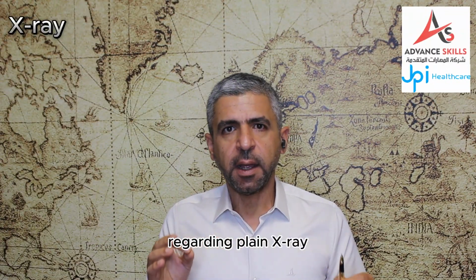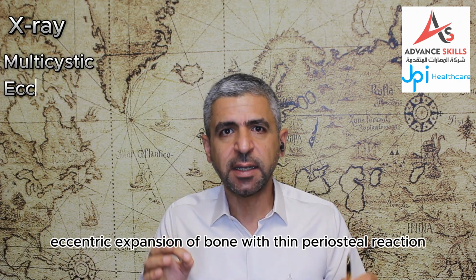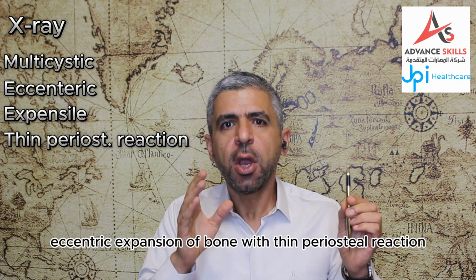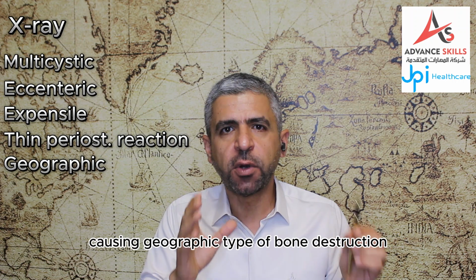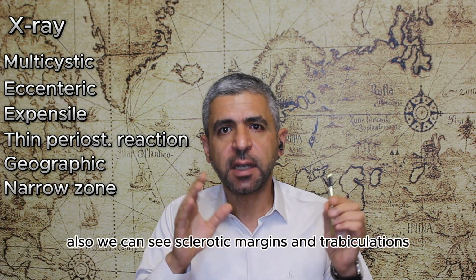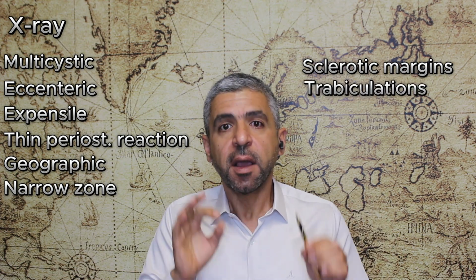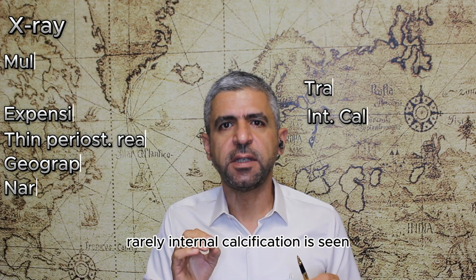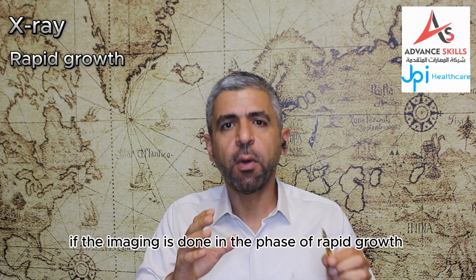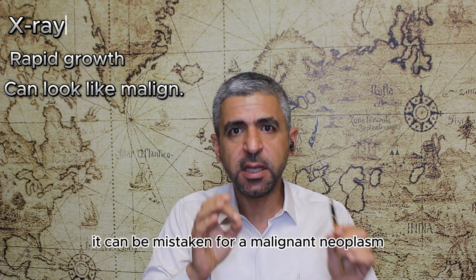Regarding plain X-ray, aneurysmal bone cyst usually appears as a multicystic eccentric expansion of bone with thin periosteal reaction, causing geographic type of bone destruction with narrow zone of transition. Also, we can see sclerotic margins and trabeculation within the lesion. Rarely, internal calcification is seen. If the imaging is done in the phase of rapid growth with marked bone destruction, it can be mistaken for a malignant neoplasm.